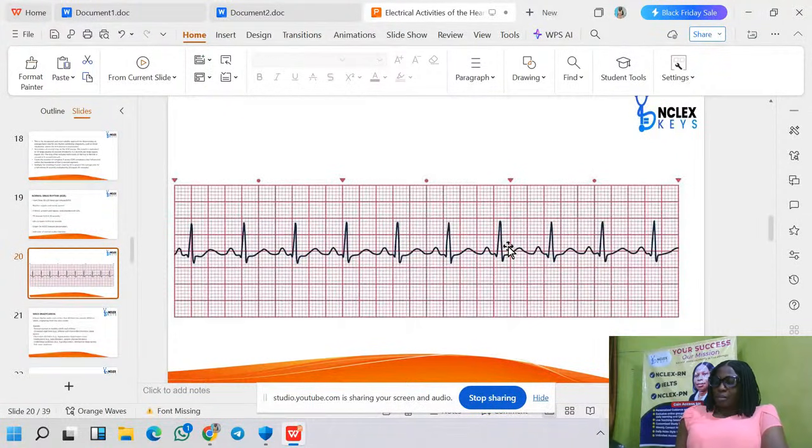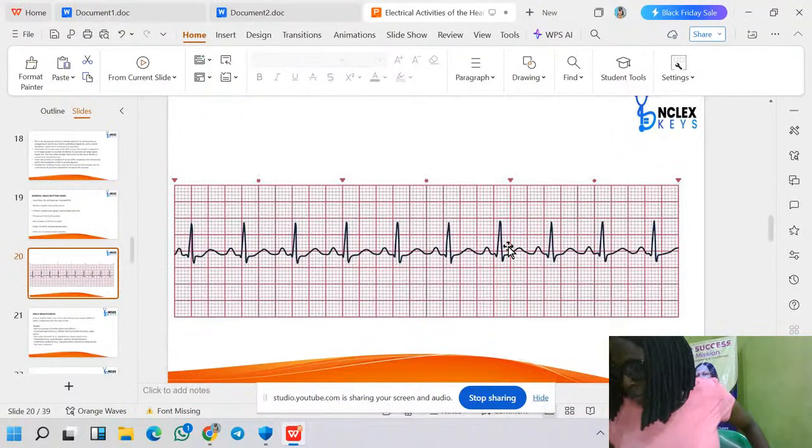Okay, look at this. How many big boxes do you have here? 3, 4, 5, 6, 7. This is 8 seconds. Now, how many big boxes do you have here?